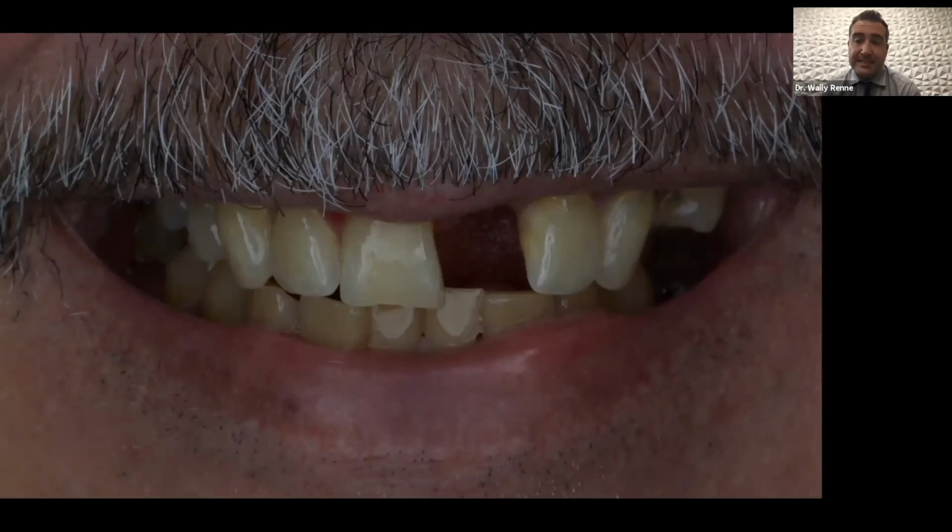Patient was happy, but when I look at it, if I had thrown that into Smile Design, I would have known immediately that there's a little bit of a size discrepancy between 8 and 9. And I probably would have added some resin to tooth number 9 to decrease the space before doing the restoration. So, I have learned in the past to sometimes, when you're doing a single central, break out the Smile Design software.